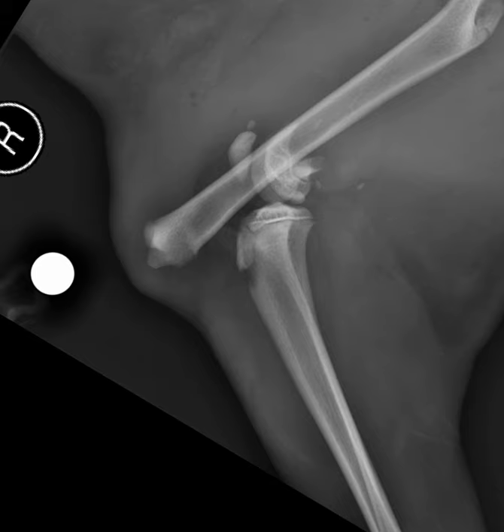Today's example is a young cat of unknown age who has been missing for 2 days and has now come home severely lame. Friends, this is a hard one to look at. What a horrible injury. Here I will give you a chance to look at both views of the right hind limb centered at the stifle region.